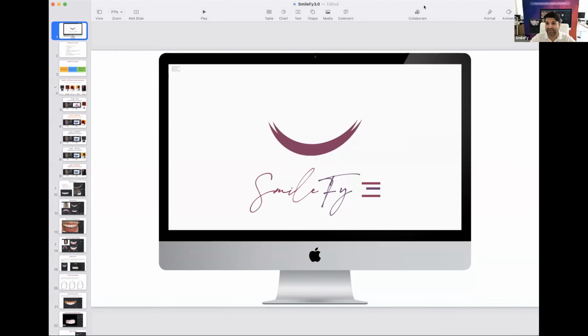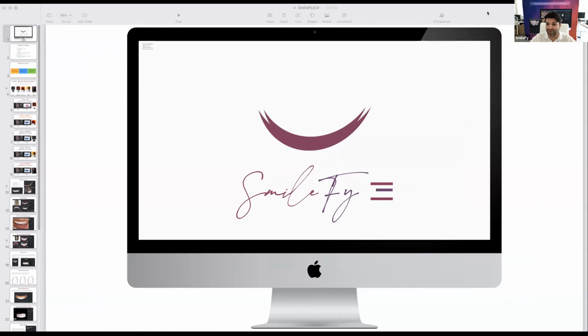Okay, so let me share the screen and start going through the features and innovations that we have.